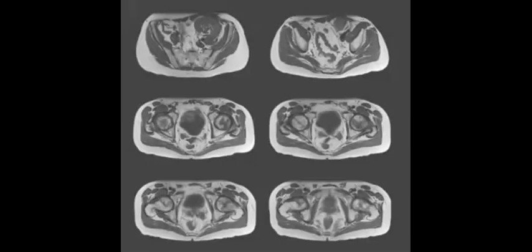You think transplanted kidney? Yes, the transplanted kidney in the left iliac region. So this patient, for the transplanted kidney, takes steroids and other immunosuppressive drugs, right? So that is why he has this appearance. So this is avascular necrosis.